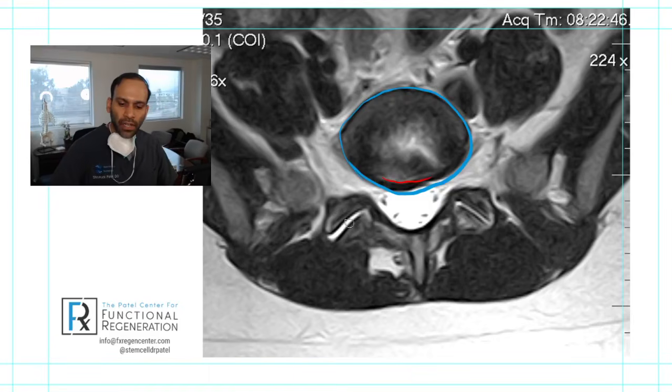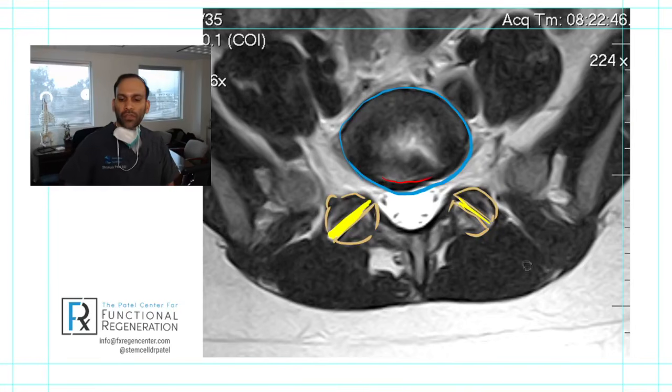But what we see here are your hamburgers, right? A little bump there. Hamburger and hamburger. But again, both of these guys are more cheeseburgery with the joint fluid in between. You can see the right one is a little bit bigger than the left one, but again, this might be the cut or the angle of the MRI that we see.